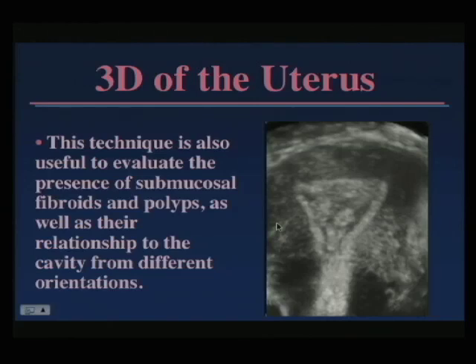Now let's go on to other displays of the uterus other than the shape.